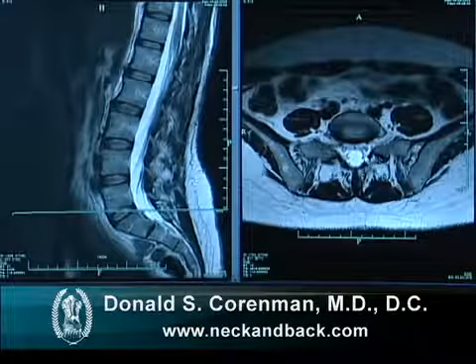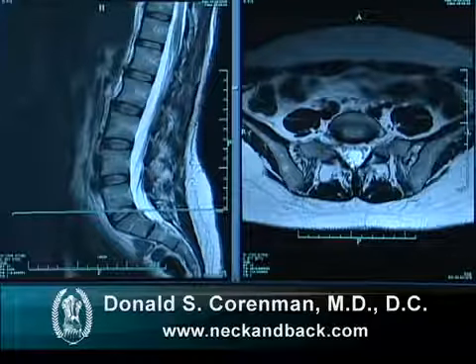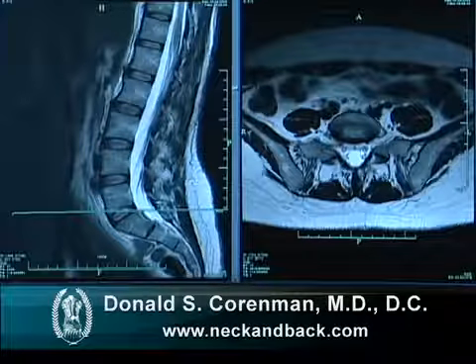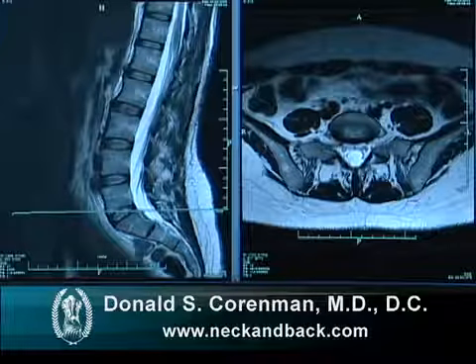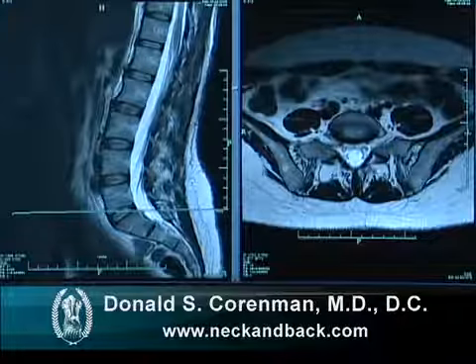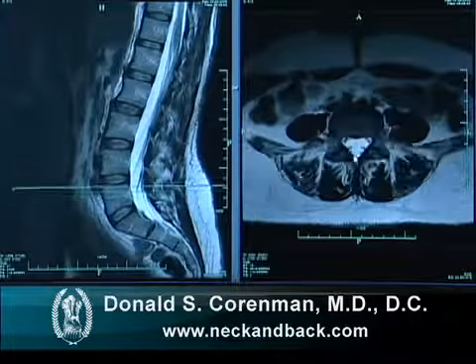At this view, this is the dural sac, the sac of nerves. All these black dots within this white sea of water are the nerve roots, and these are the nerves that have already exited out of this sac. These nerves exit like branches on a tree. So this is the 5-1 level, and as we march up, we then get to the 4-5 level.